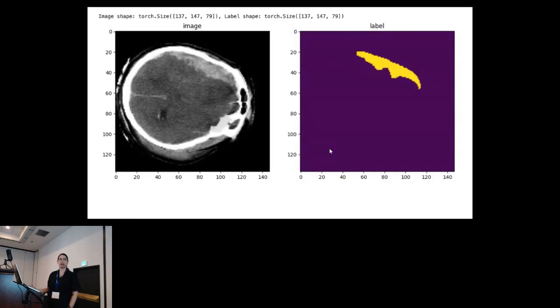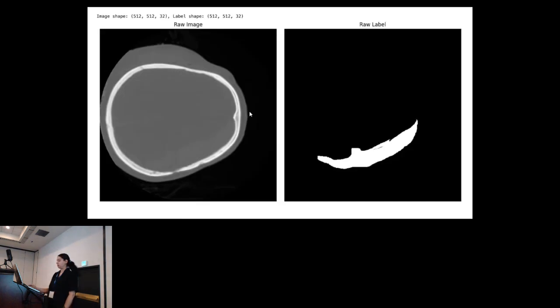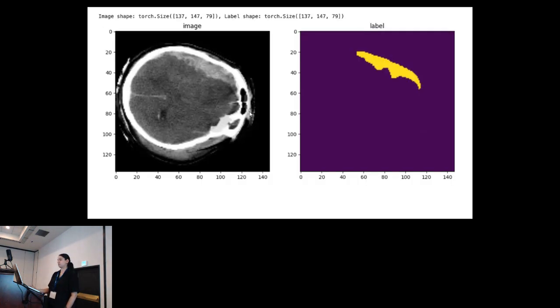Now, using MONAI, when we have done all our pre-processing, we have set the contrast. So this is the same image as this one, it's just flipped. After all the pre-processing that we have done, now you can actually see this is the region of interest, and this is our masks that we created. And now we can actually give this to the model architecture and tell it to train itself. So we have done a lot of pre-processing on this, which we'll talk about.